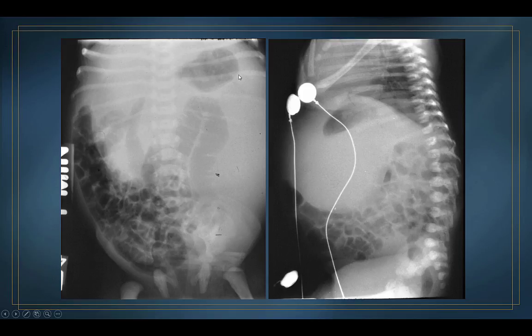This is the baby that you can see has a clear left-sided abdominal mass. And again, look at this loop of bowel. It should be much more loosened than that, so that's just a sign that, again, it's being either compressed from the front or from behind. And in a newborn, most neonatal abdominal masses, particularly large masses, are going to be involving the right or left kidney, so it's going to be a retroperitoneal mass. And in this case, there's either a second mass or this left-sided mass extends across the midline to the right side.